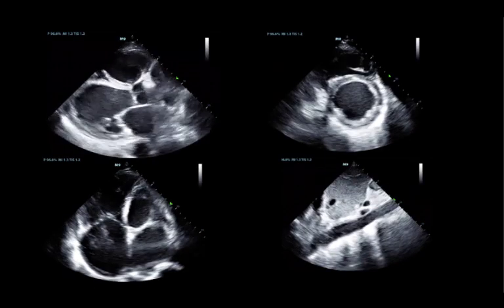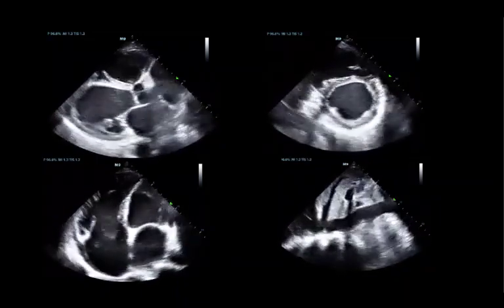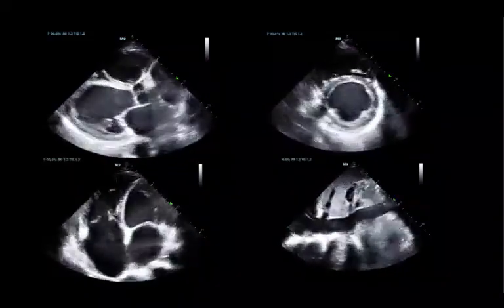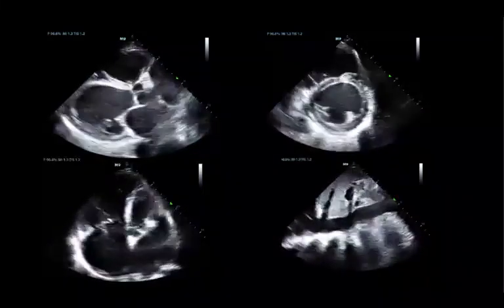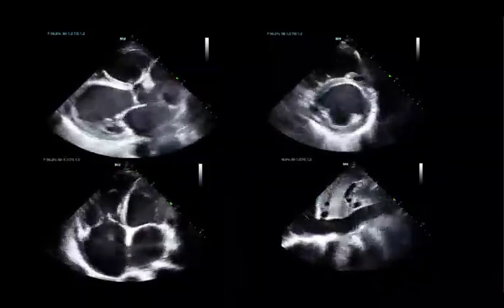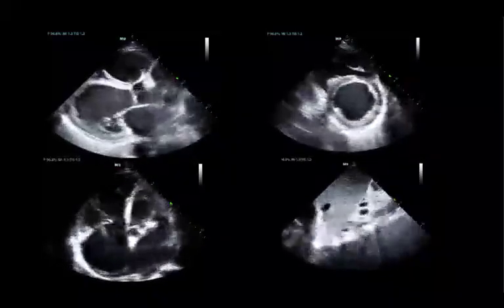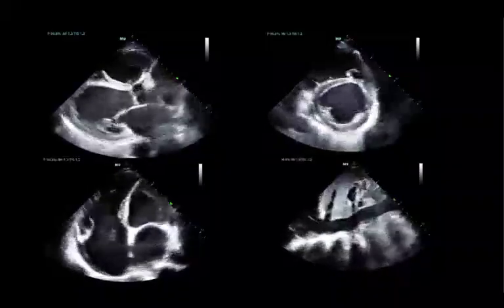These are clips of a patient that is representative of something that you see often. This patient is clearly in shock, right? You have your eyeball, and according to the literature, our eyeball is pretty good at recognizing the cardiac function, specifically the left ventricular function in that patient. Even if I ask a random intern here, I'm sure they'd say, yeah, that's probably an EF of 10%, clearly, maybe less, 5%. But there's more information here, and there are many scenarios in which I want to know actually more.